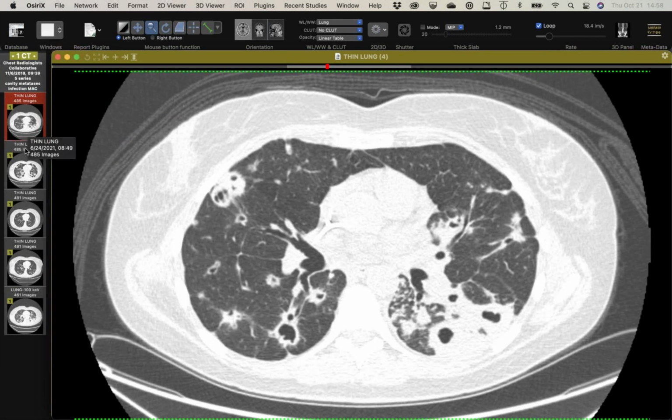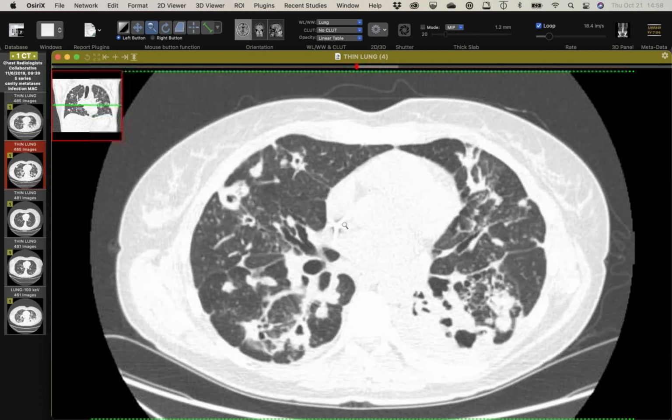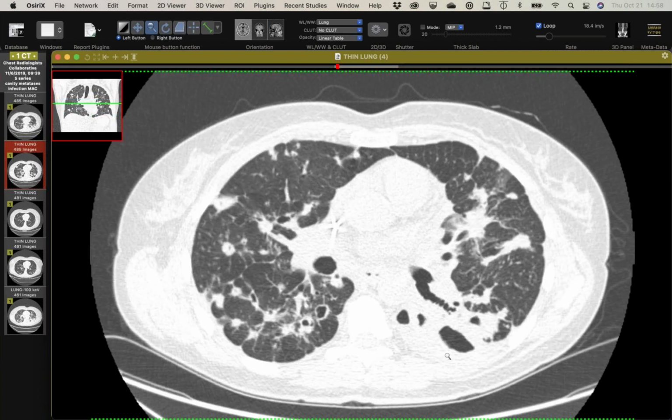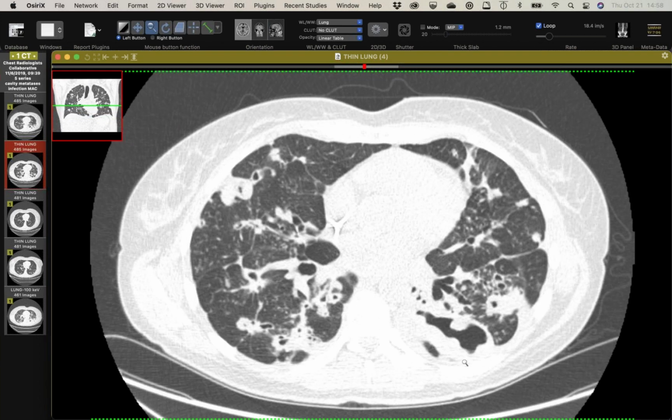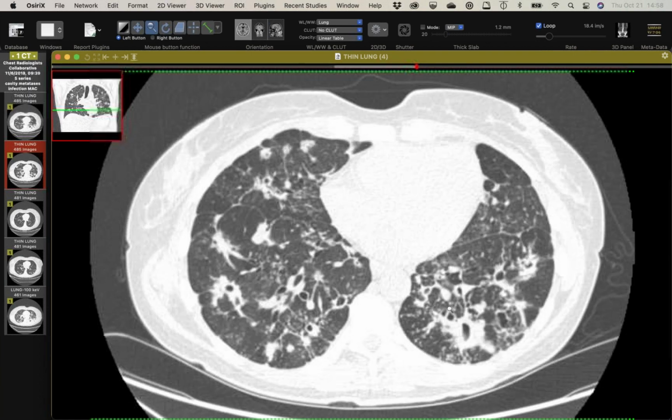Now it gets a little more interesting. She had good susceptibility, so she's been on rifampin, ethambutol, azithromycin, and I think Zosyn. And this is her most recent scan, and she's developed some bronchiectasis in this cavity, and it's become even more complex. And I'm curious what you guys think.